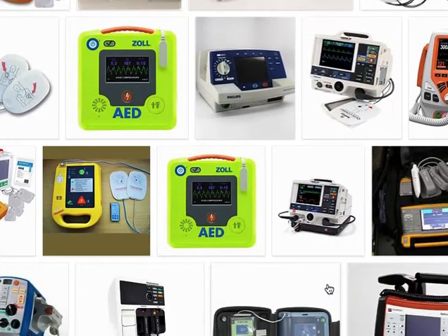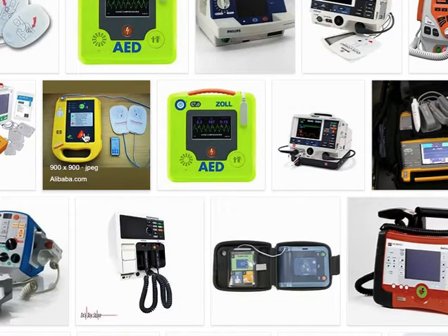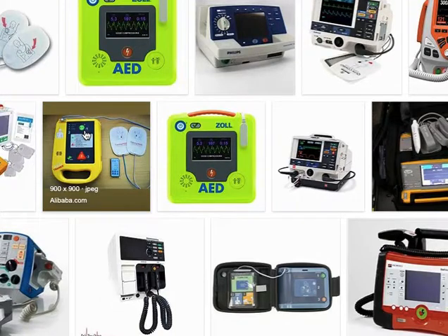And the good thing nowadays is that even a very small defibrillator is very easy to use. They guide you and give you instructions, like put one patch on the right upper chest and one patch on the lower chest, and then it will tell you to leave the patient and not touch the patient. I am assessing the rhythm, and I am assessing if the rhythm is shockable or not shockable. So nowadays the defibrillators are doing a lot of the job.